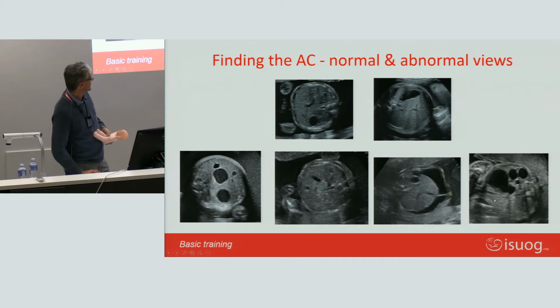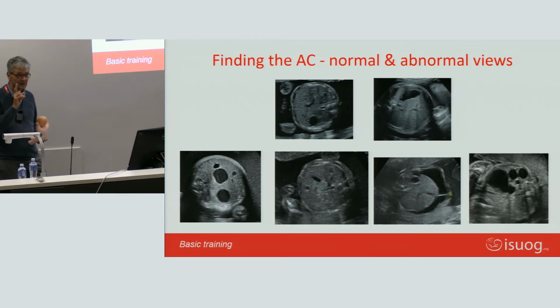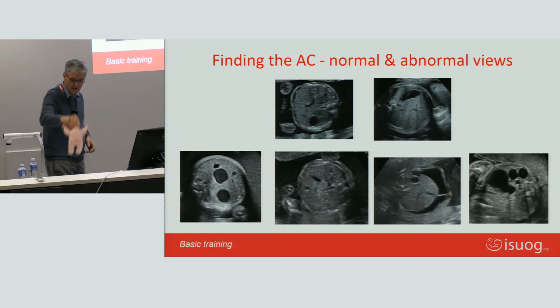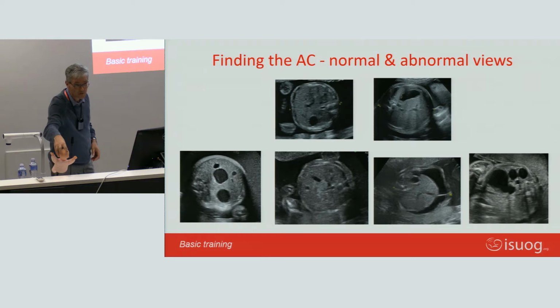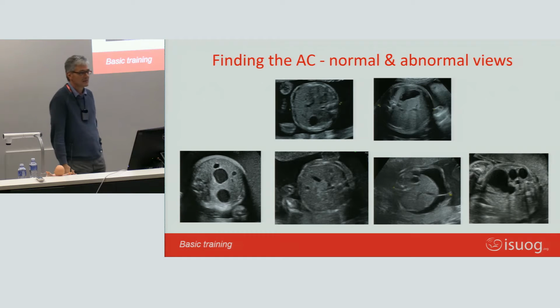So which of these babies? Now all four of them are standing in front of the bus, and the bus driver says, I've got space for one. And they're actually checking today, so I can't just load up more people. So I can't, as usually, put 20 people in my 12-seater. So one of you can go. So which of those get onto the bus? The ascites, why?